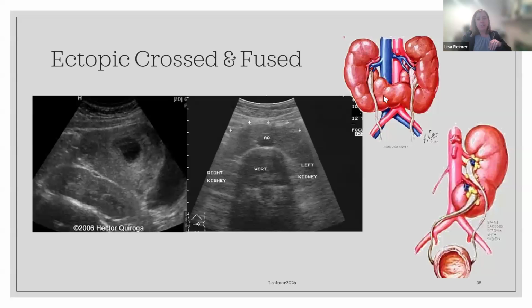So the kidney is fused at the lower poles and it sits centrally across the great vessels. So I share this with you because if you go and look for the kidneys and where they are normally supposed to be, and you're not finding them, you might want to try just scanning over midline. You might see a suggestion of the kidney, but it looks anomalously placed in the body.